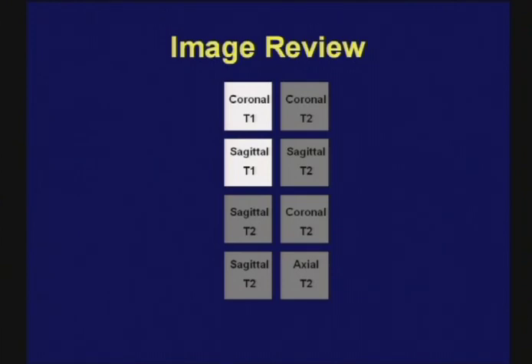Again, I promised a little bit reluctantly to show you the way I review the images. Not, again, that you should do this, but develop a plan that you do almost every single time you look at the shoulder MR. I start with coronals with a split screen, a fat-sensitive, fluid-sensitive side by side. I go to sagittal. I often mix the sagittal and coronal when trying to evaluate the rotator cuff.